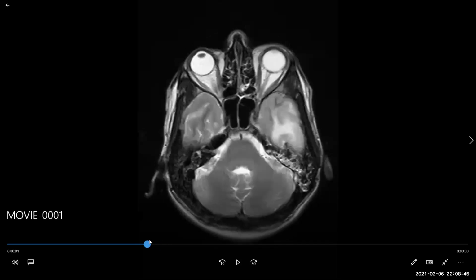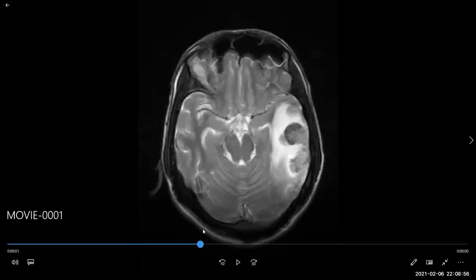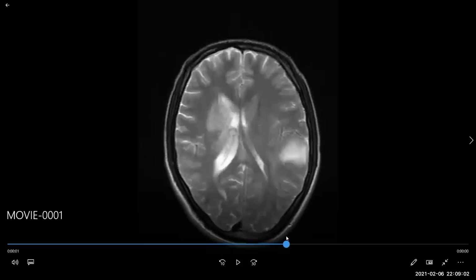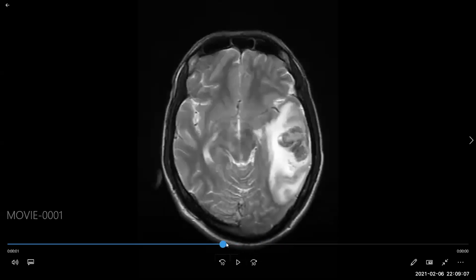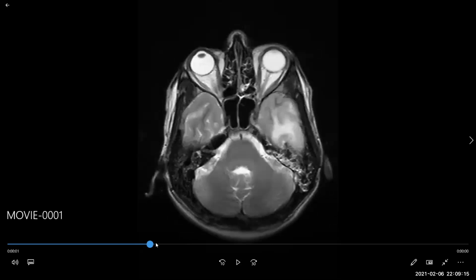So I want you to look at the T2 again, and any cause you can make out. I am looking at the flow voids, the vessel flow voids. I am looking for any aneurysms with hemorrhage. You are looking for aneurysm? No, sorry. I'm looking at it, it's a non-arterial territory. I'm looking at other causes.